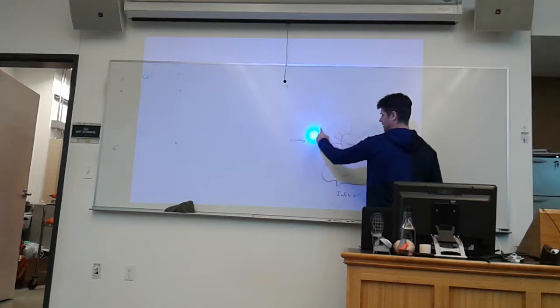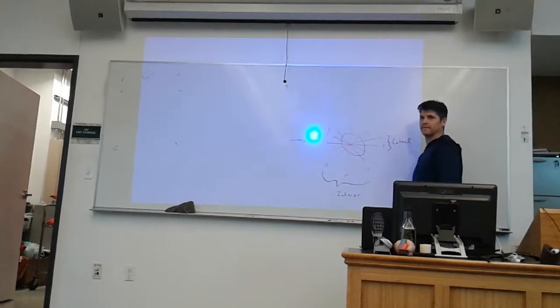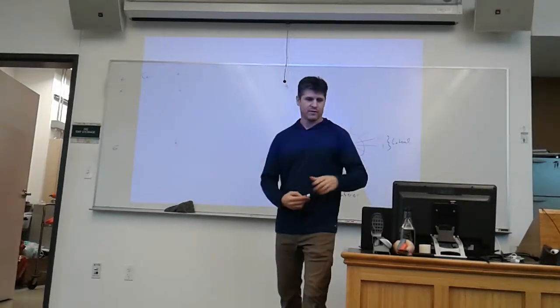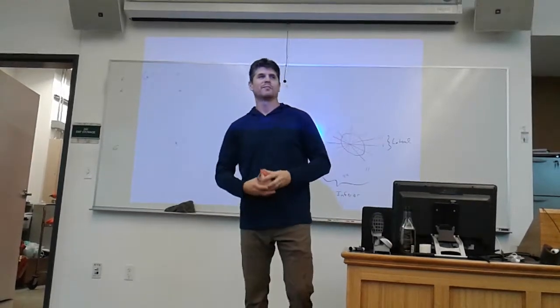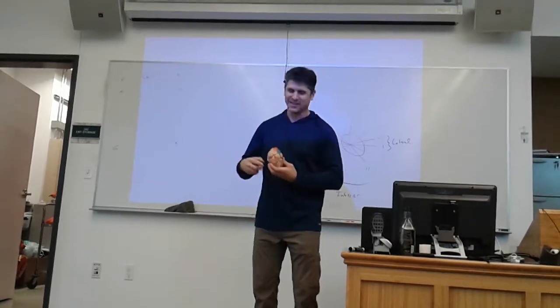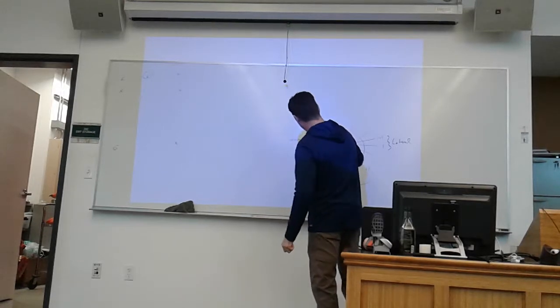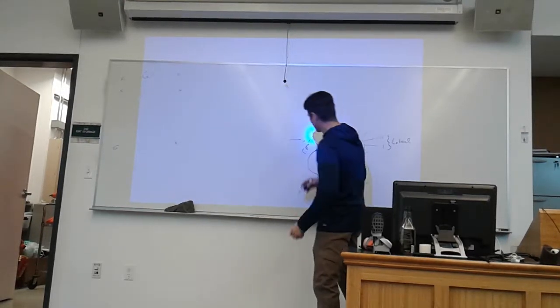Inferior. Left. Right. My goodness, how many medical terms can we throw out? Right. What part of the heart is this side? The right side of the heart. Good job. These look at the right side of the heart.